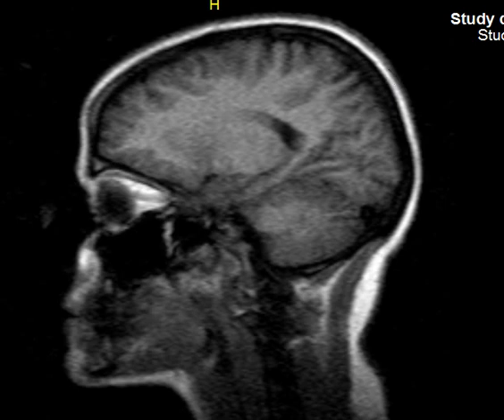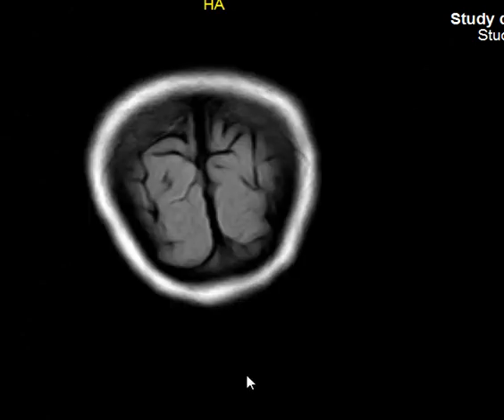So, first of all, this is a brain MRI of a young patient that we have recently, I think. Yeah, it's been a few days for the imaging. Anyway, before we start, the whole lectures will be on the YouTube channel. You can just go there, see whatever you like, review it as you like.